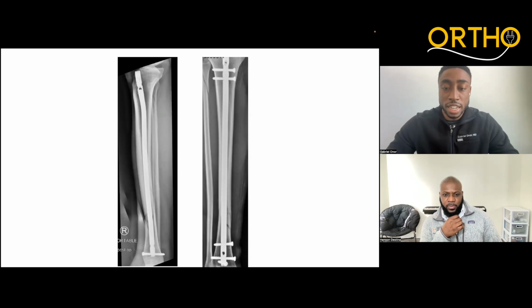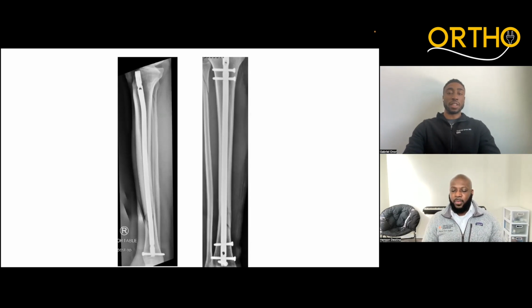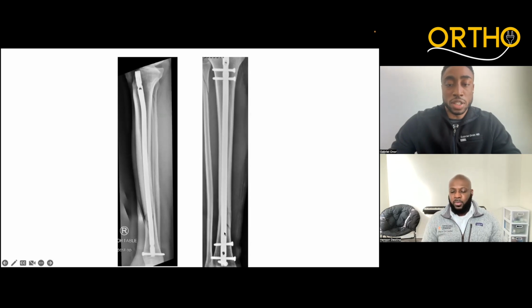And as you can see here, we really want to get the fracture fragments to key in, because with the fracture, the displacing forces are going to cause the fragments to malrotate, and so that's why you can often see dramatic clinical pictures of where you're getting an AP of the patient's knee while you're getting a lateral of the patient's ankle, just due to the rotation of the fracture fragments.